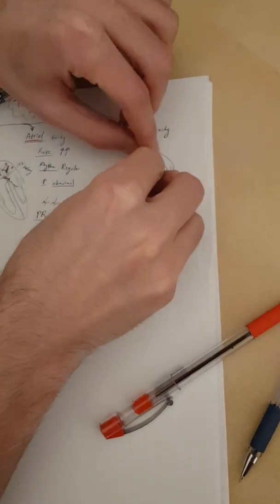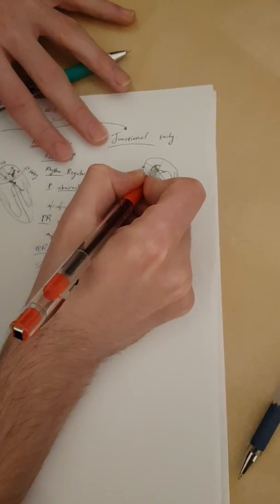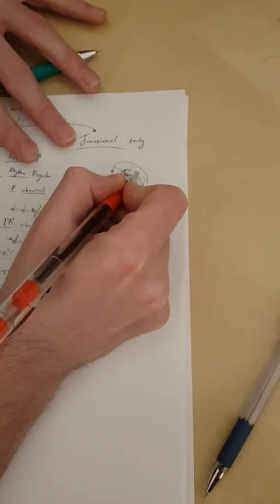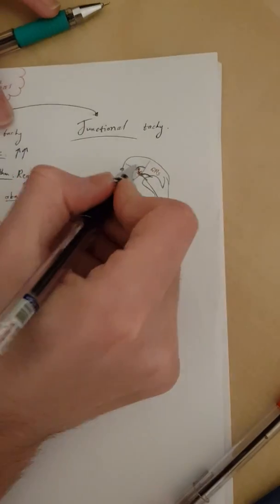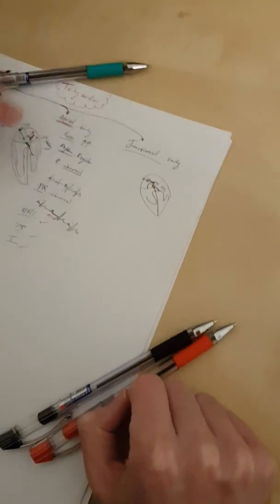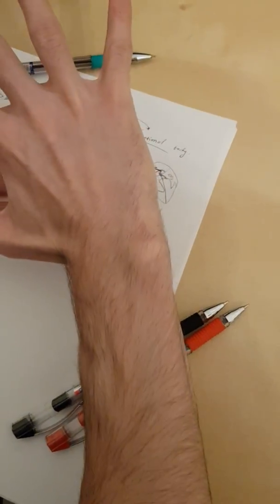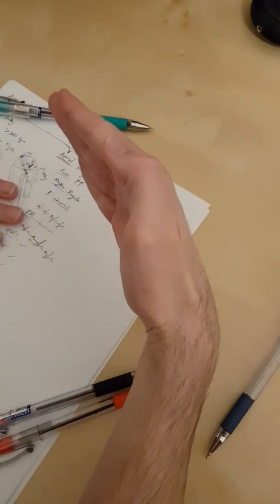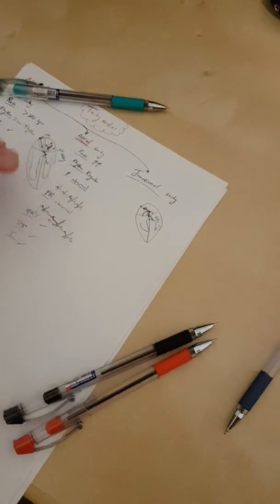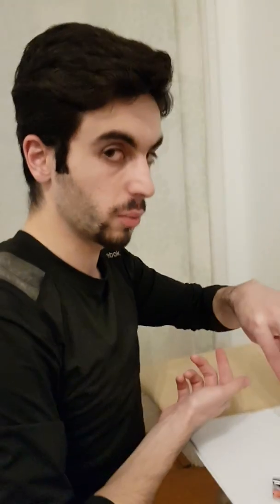Then from the ectopic focus, it will spread everywhere. But the main two directions are the one that goes to the AV node that gives the QRS, right? Like there, and QRS. That's the red one. And this one in black will go opposite, towards the SA node, and it will depolarize the atria that way. Now, what's the normal way for atria to depolarize? This way. So this one goes that way. How do you see it on an ECG? Opposite P. Okay? It's not just different, it's opposite. So it will be positive where it should be negative, and negative where it should be positive.